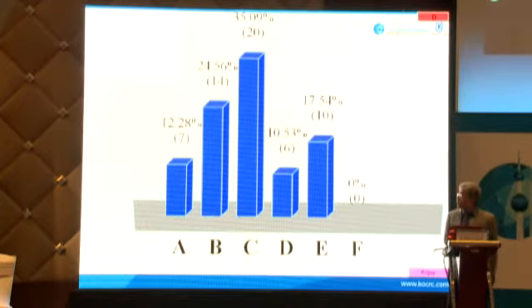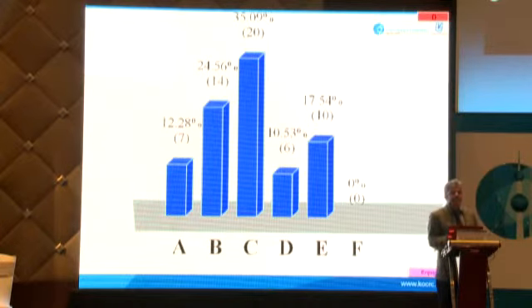Okay, take the remote in your hand and answer this question. A, B, C, D, E, and OK. All right, most of you got it correct. It is constructive interference in steady state. That is the FIESTA sequence. You can get sub-millimeter high resolution images which cause CSF to be bright, so any cisternal component of a nerve can stand out within the bright CSF and you see it very well.